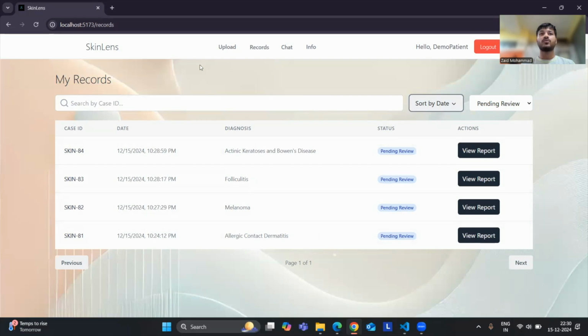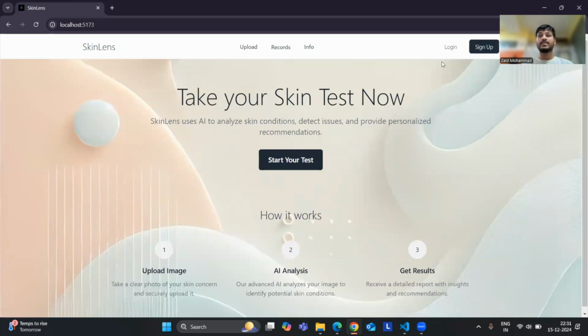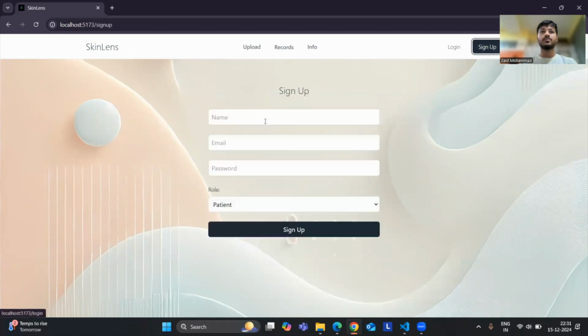For this, let's log out. Now let's create a dermatologist account for this particular demo. Let's sign up.